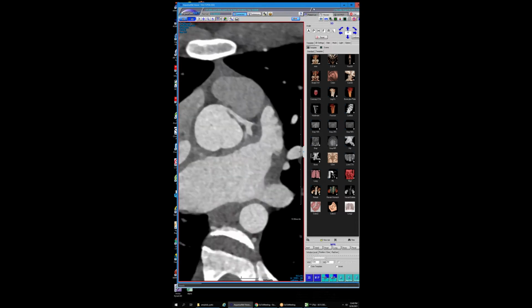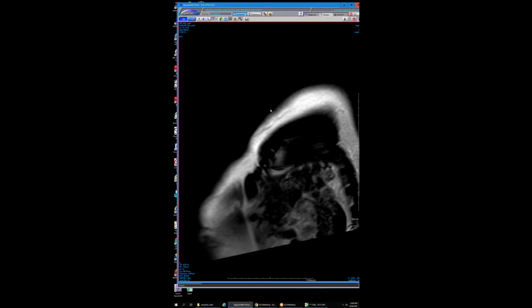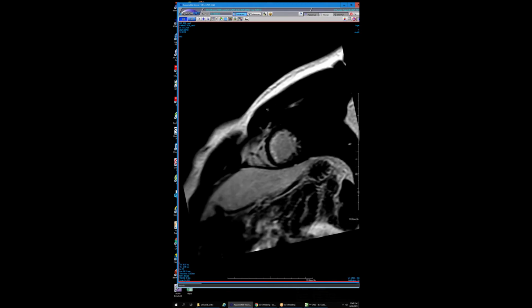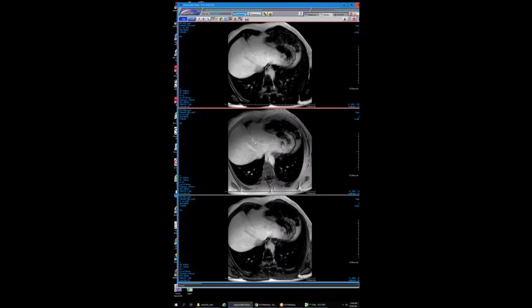That itself is kind of interesting. The other interesting thing, one thing I had not seen in a long time, is that he actually had, not the best looking, this is the outside MR. The four chamber shows it better, let me show the four chamber. It's prettier. He actually had infarct in the left main territory, so not good. So he had that fixed, but we'll see how much.